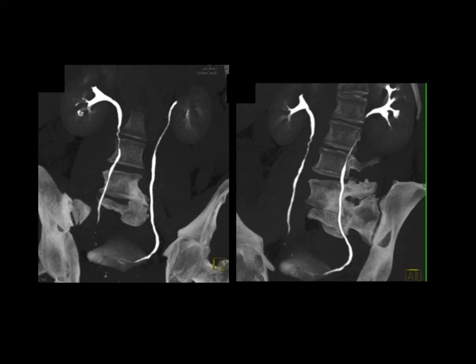But if you look at this case, what you notice is in the proximal third of the right ureter, it's mildly dilated, and there's an area of irregularity. There's a classic beading present. This is not peristalsis. This is not infection. This is going to be a malignancy. And when you start looking, what is the best idea? A urothelial tumor, a primary tumor.